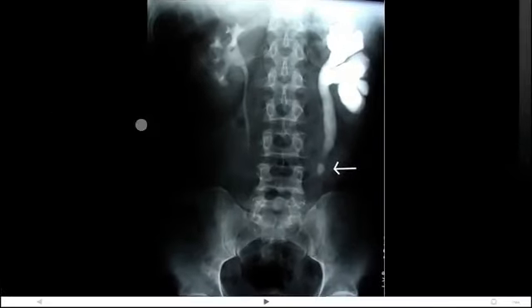However, in renal stones, 90% are radio-opaque and can be discerned on an abdominal film. However, a KUB film is more appropriate, and the film is repositioned in order to accommodate more of the pelvis and thus demonstrate the kidneys, ureters and bladder.